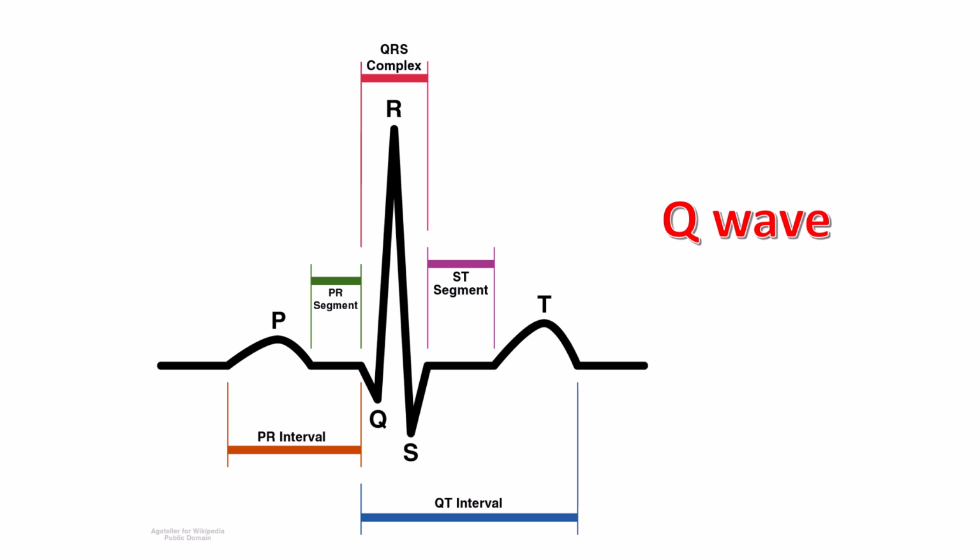Hello everyone, today I'll be discussing a short topic on ECG, that is the Q wave as well as the pathological Q waves. Here I will be representing an ECG diagram showing P wave, QRS complex and T wave.